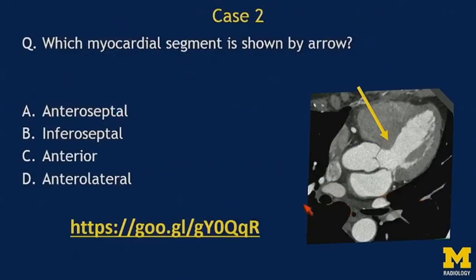So again, let's use the audience response question. Which myocardial segment is shown by the arrow?